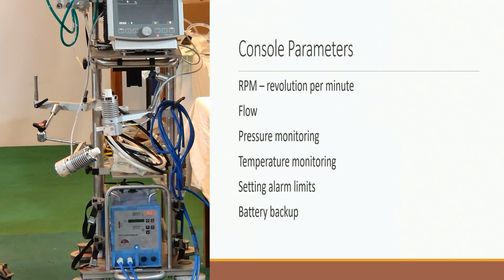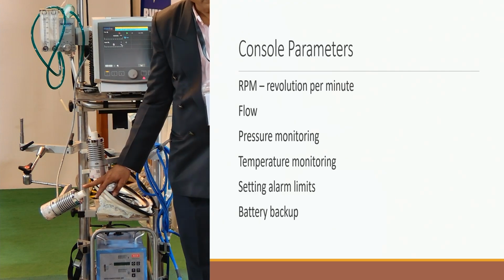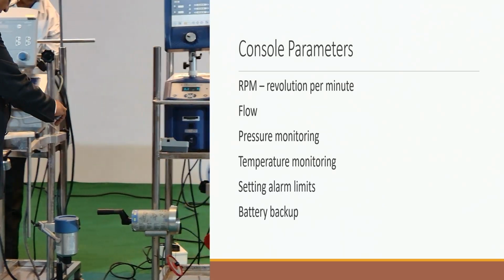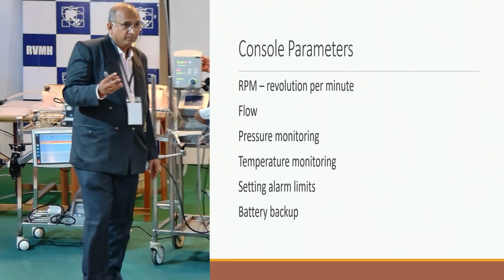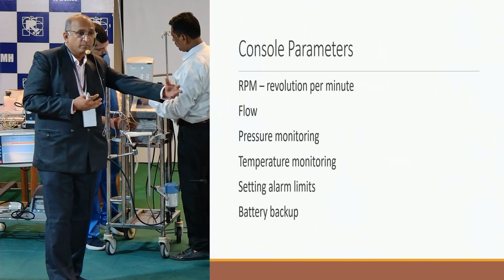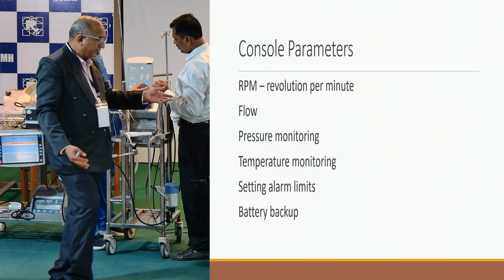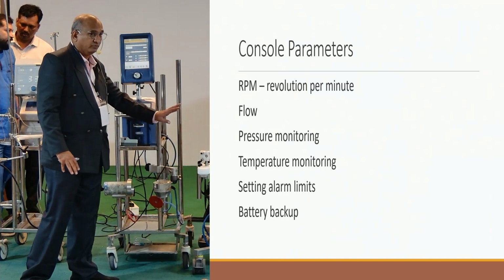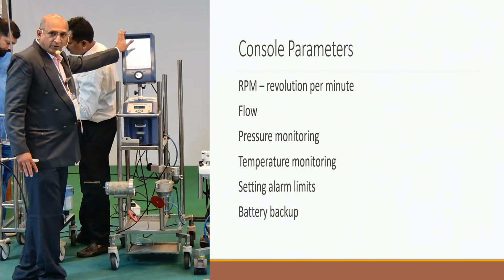So you have only one knob to adjust. Now what is important, what you observe: see the external motor drive of Medos, of Maquet, of Medtronic, of Sorin. Each has a different design. So the pump of each is going to be different, and you cannot mismatch the pump. You can't use a Medtronic pump for Maquet. You can't use a Medos pump for Medtronic. You can't change the pump because the design is type specific. So you have to use a Medtronic pump for Medtronic, and a Maquet pump for Maquet. The design is type specific, so you have to be mindful about that. Other factors, as I told you, which are important: here you can get P1, P2 monitor pressures.